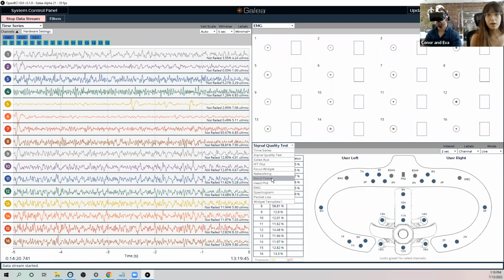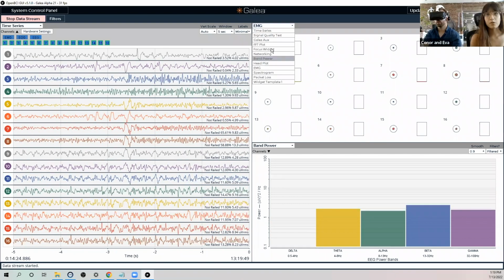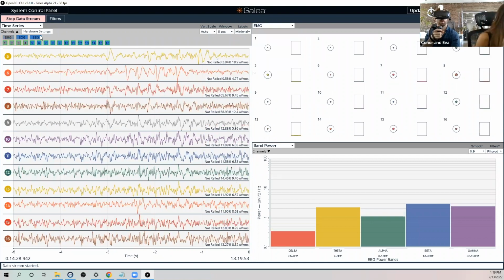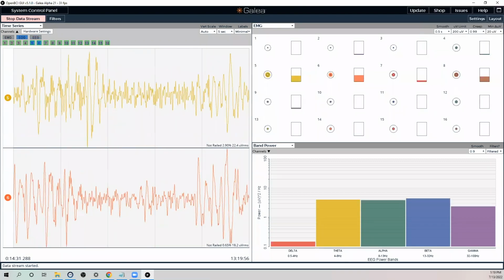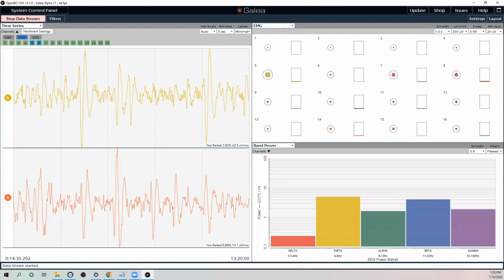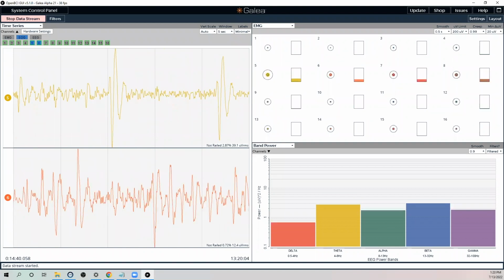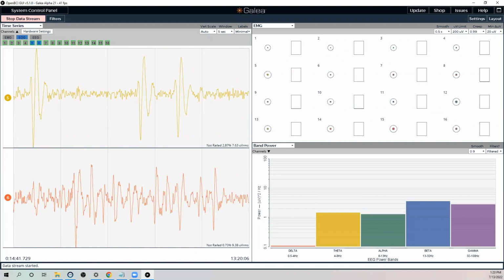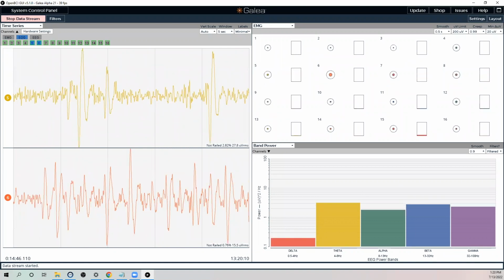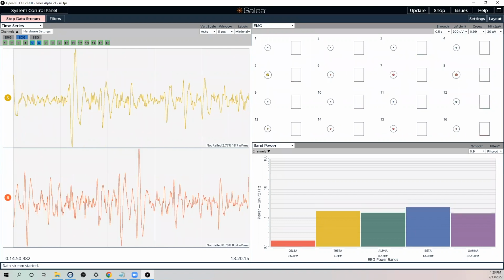So now I want to show you guys EOG before we move on to EEG. Cool, yeah, let's do that. So for that, actually, there was one good question that came in. I just wanted to stop for a question about whether the headset is plugged in just for the VR or for the data transmission as well. So while you answer that, maybe you can also talk about what headset we are using currently, what headset the beta will use, and a little bit about the wired and wireless transmission.